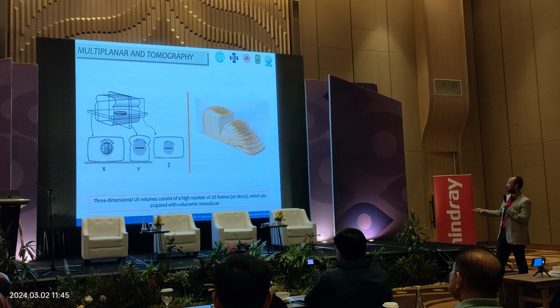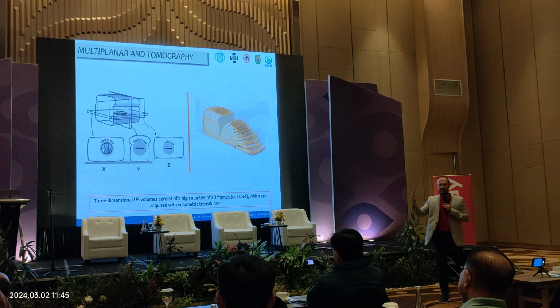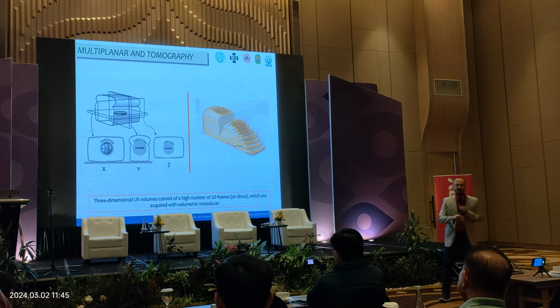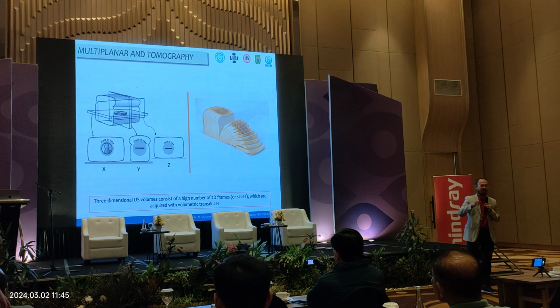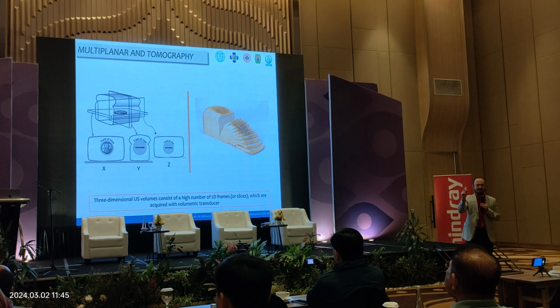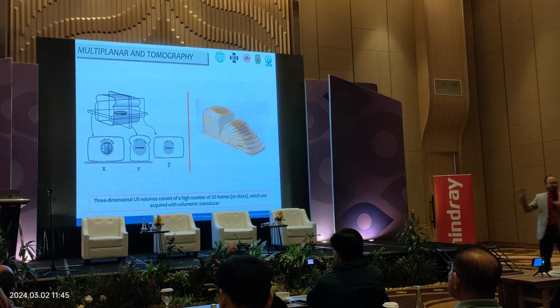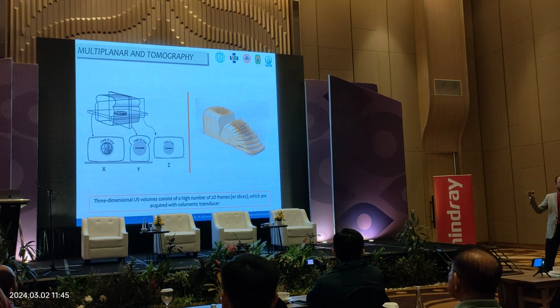Tomography is different. It's like slicing the bread with the same plane in parallel, moving forward or backward, and it relates to what we want to see: how many slices we want to use and how thick the slicing should be. This is the fundamental aspect of multiplanar and tomography, so please keep this in mind.